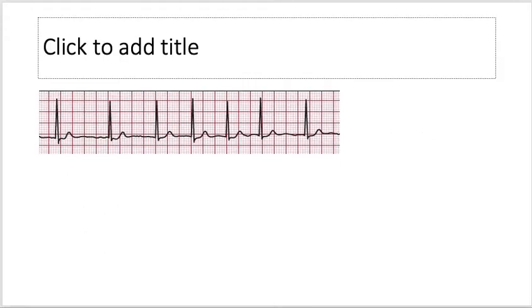One method that I like to take as an example is if we had this rhythm strip here, say it was going a little bit faster, it'd be hard to really see whether there was the same distance between, say, this RR interval and this RR interval. So sometimes if it's a little bit more complicated, what you can do is take a sheet of paper and line it up so this edge is here. So all you have is just the little blips of the R waves pointing up above the edge of that strip of paper. If it's right along here, you can then line it up and see these little blips of where the R waves would be. You make a quick notch with a pen or a pencil on the piece of paper, and so you have that determined distance between the RR intervals.